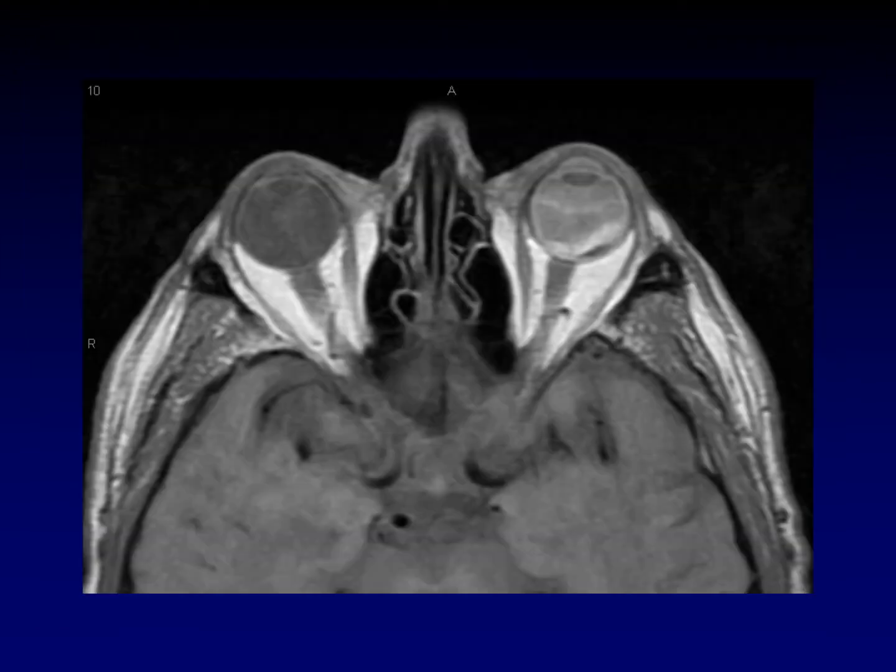Often you get combined hemorrhage. There's a subhyaloid horizontal line here. There's more of a V-shaped look to this part, and then there's this little ball-like area. So probably all three layers detached from one another in this example.